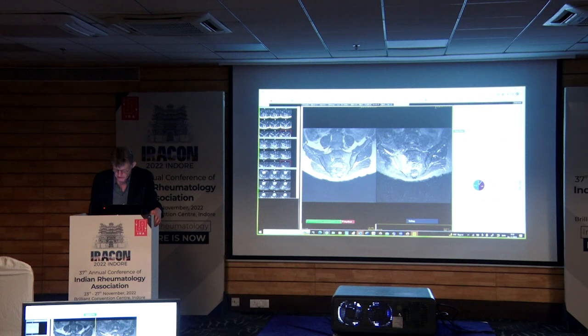Oh, what happened? There it was. Then there's the ankylosis. Yeah, then you can say more or less half says that there's ankylosis on the right side, and the other half says that there's not ankylosis. I'll come back to that.